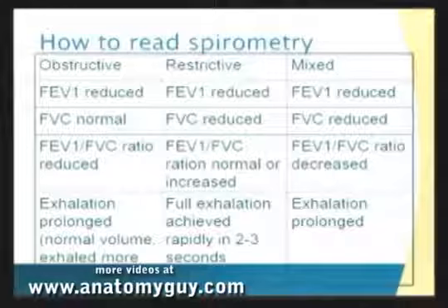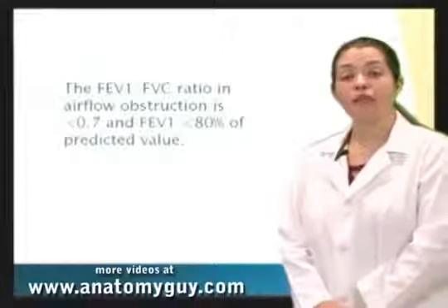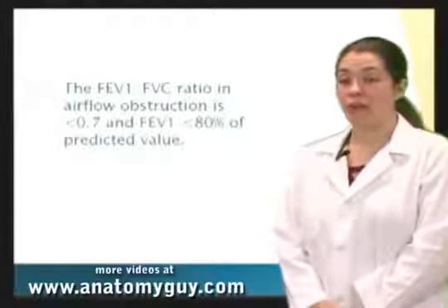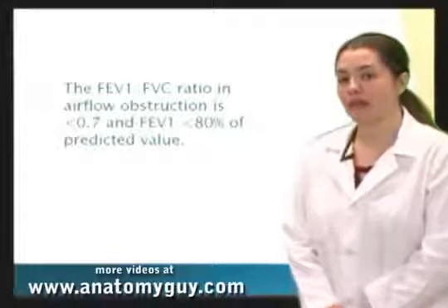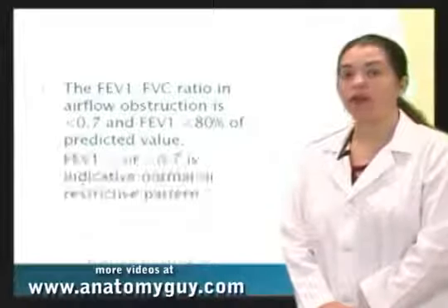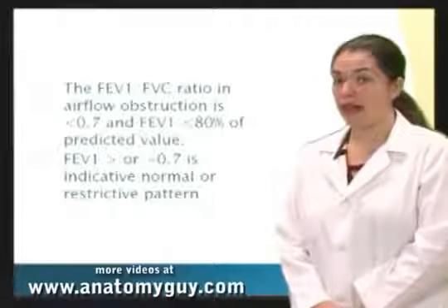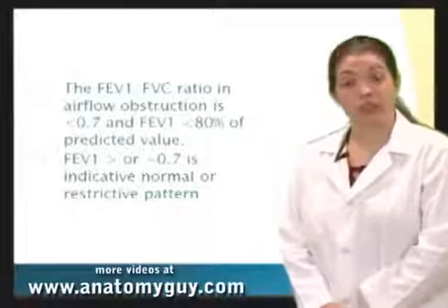In a restrictive pattern, both the FEV1 and the FVC are reduced, so our ratio is going to be normal or perhaps a little increased. And when we have a mixed pattern, the FEV1 and FVC are also reduced, but that ratio is decreased. In airflow obstruction, the FEV1-FVC ratio is going to be less than 0.7, and the FEV1 is going to be less than 80% of predicted value. If the ratio is greater than or equal to 0.7, that is indicative of a normal or restrictive pattern.